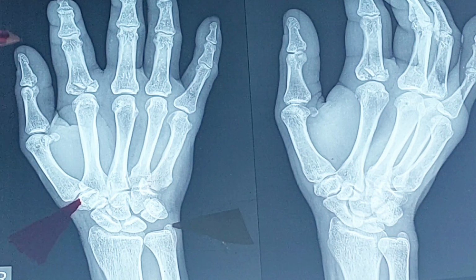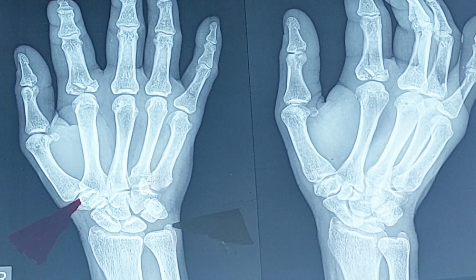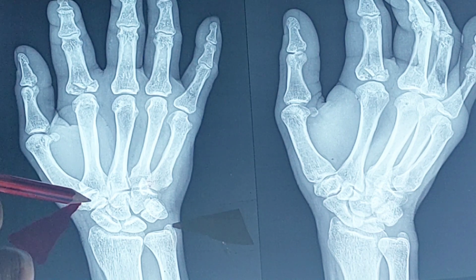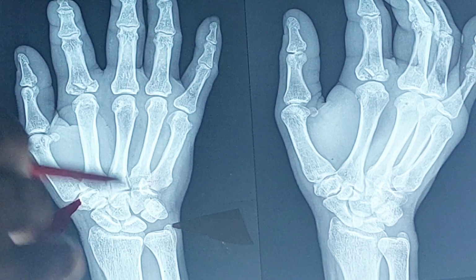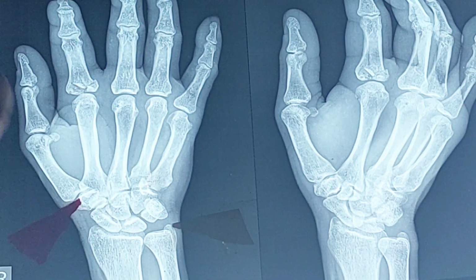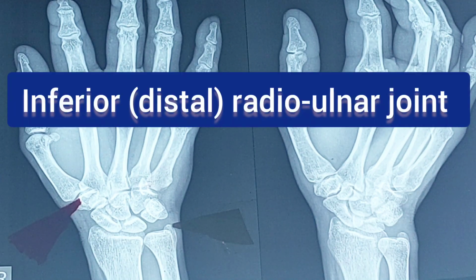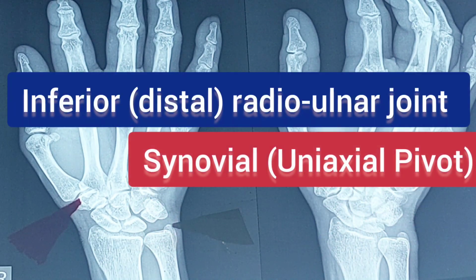But in case of thumb, there is one interphalangeal joint because there are 2 phalanges only. So interphalangeal joint, metacarpophalangeal joint, carpometacarpal joint, intercarpal joint, then intermetacarpal joints, and the wrist joint, and also the inferior radioulnar joint. So there are so many joints.